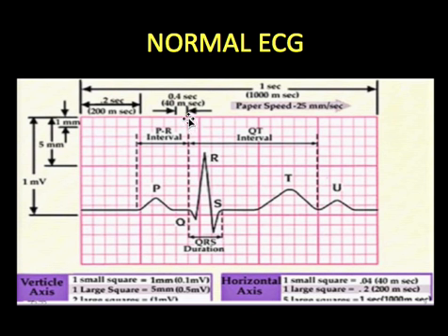So one small square is equal to 40 milliseconds. We are talking in milliseconds. We will not put a decimal and confuse it with seconds. So just say 40 milliseconds, one small square. This border of one large square is made up by 5 small squares, so that is 40 multiplied by 5, which is 200 milliseconds. So remember, one small square is 40 milliseconds, and 5 small squares is 200 milliseconds. Just ignore this 0.4 seconds. It is actually 0.04 if you like decimals. This is a printing error here.